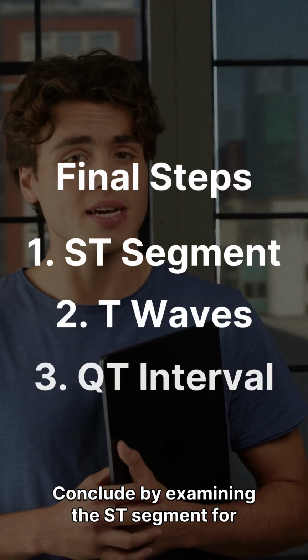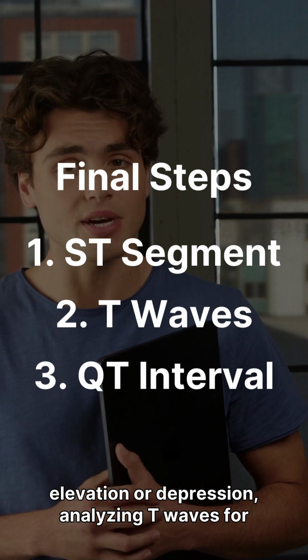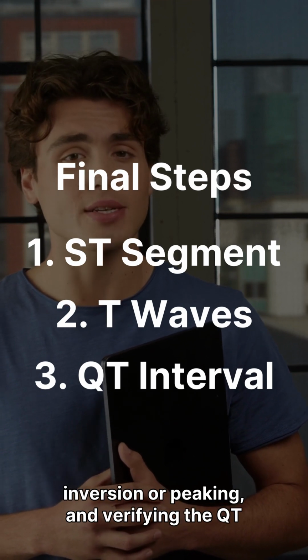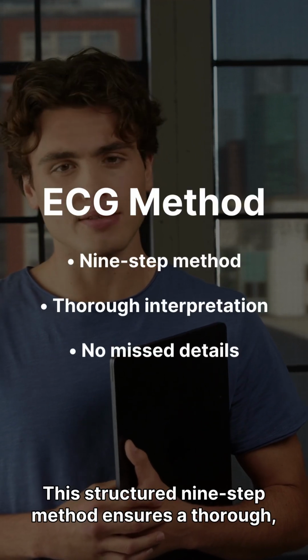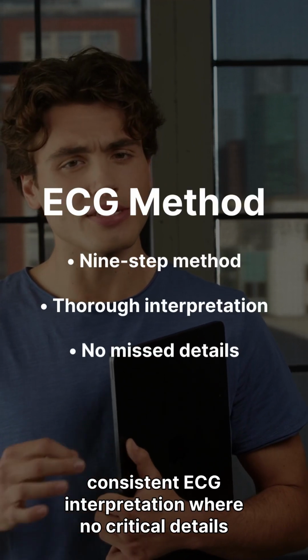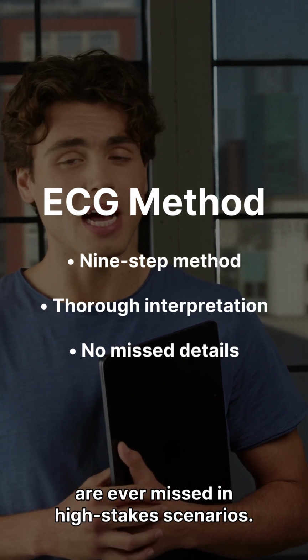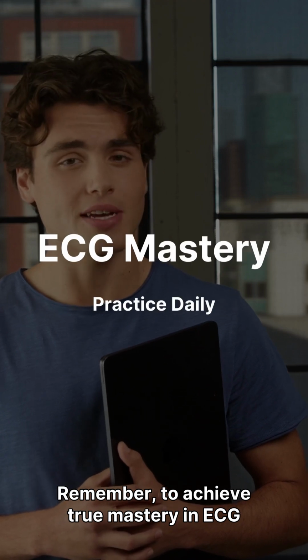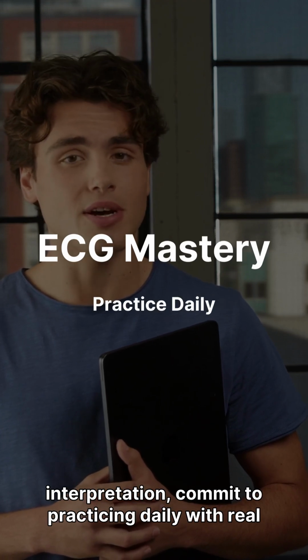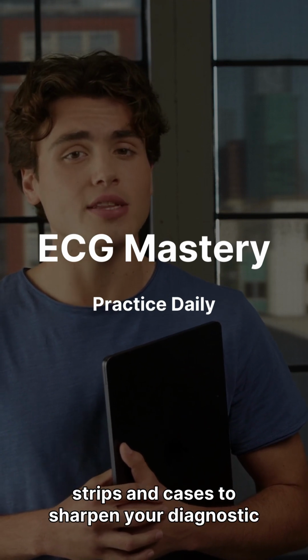Conclude by examining the ST segment for elevation or depression, analyzing T waves for inversion or peaking, and verifying the QT interval length. This structured 9-step method ensures a thorough, consistent ECG interpretation where no critical details are ever missed in high-stakes scenarios. Remember, to achieve true mastery in ECG interpretation, commit to practicing daily with real strips and cases to sharpen your diagnostic skills.